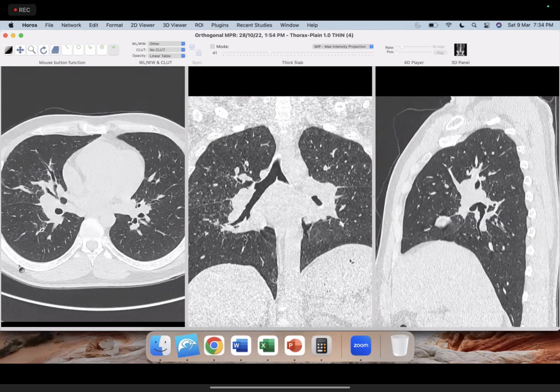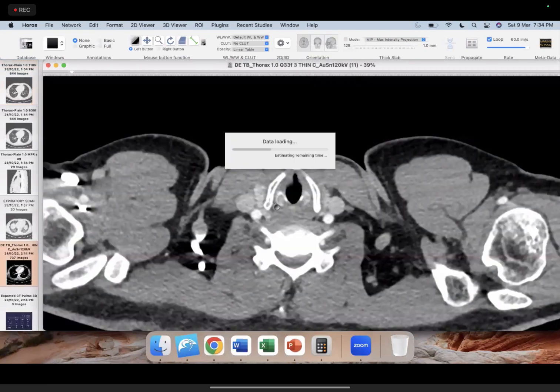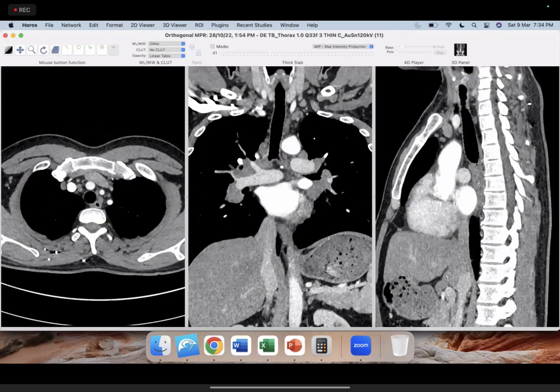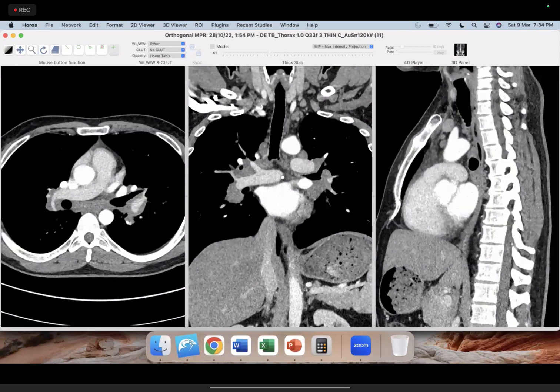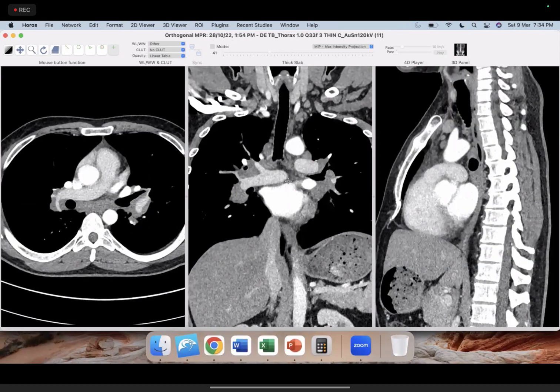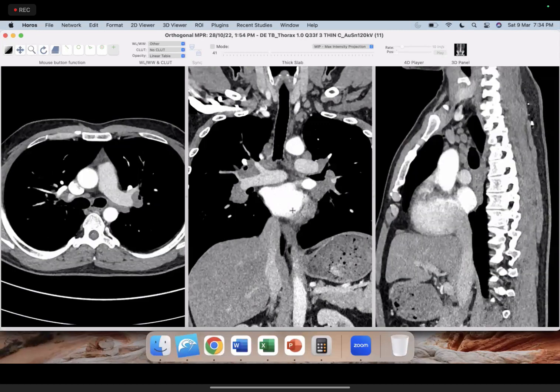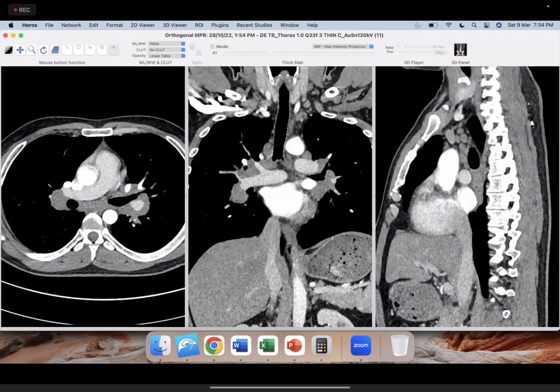And then of course you will want to see the plain scan also, and this is one of the times where you will do contrast also, because on plain, once you see that there are lymph nodes, it is a good idea to see whether there is necrosis or not, because remember, in sarcoid also you can still have tuberculosis. So we have seen many examples with this typical sarcoid appearance. The plain scan showed lymph nodes, nobody then did contrast, and they were actually showing necrosis, and the patient also had tuberculosis. So that's why it is very important. So remember, it works both ways.